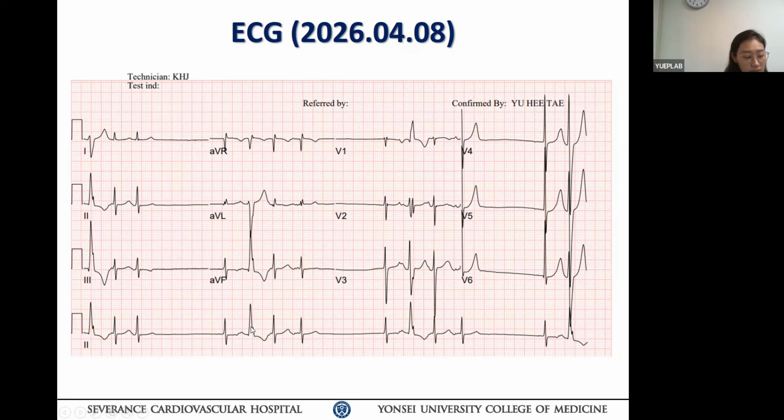Okay. And after that, there comes another beat, but the P wave is not very clear. Is it a sinus beat coming at its own time and a P wave deformed by the QRS of the previous beat? And then there's another beat which has again a different QRS morphology, this P wave morphology, and the same pattern repeats.